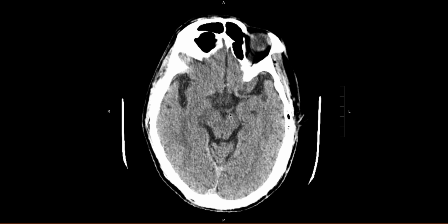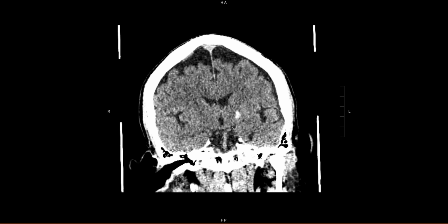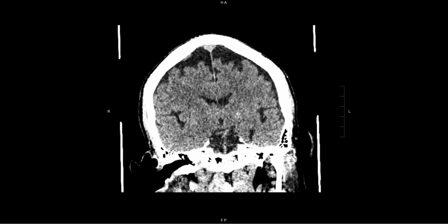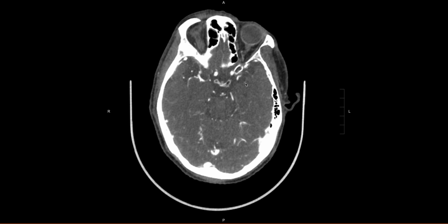However, it's hard. And if we go to the coronal, I have to admit, I don't really think it's the most impressive hyperdense basilar sign. So this is something that may not really be readily apparent on the non-contrast. This patient obviously had symptoms, and this was a code stroke that was done given their neurologic symptoms.